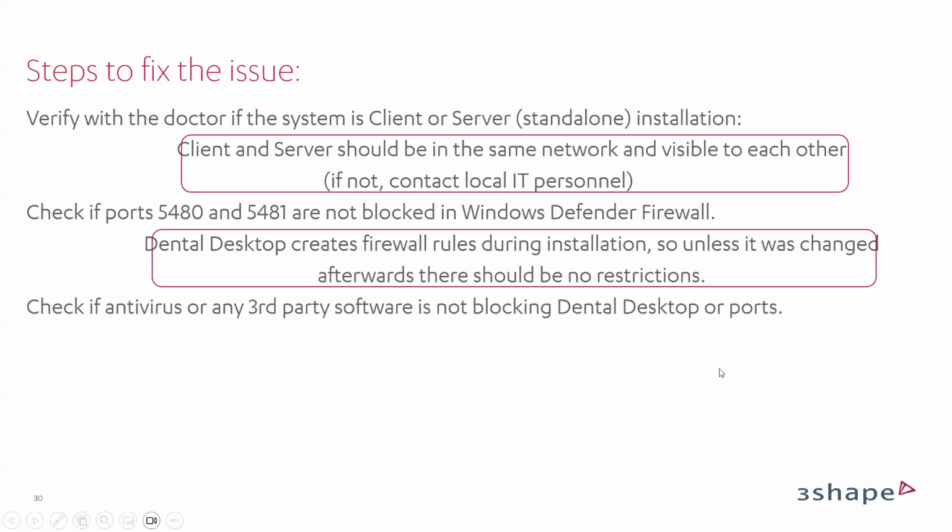Check if the antivirus or any third-party software is not blocking Dental Desktop or ports as well. We do not recommend our customers install third-party antiviruses on the systems where we use our software, because it may detect the Dental Desktop software as malware and usually blocks it.